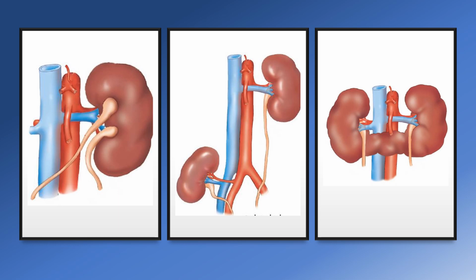Here we've got that bifid renal pelvis with the duplicated collecting system. We can only see the proximal part of these ureters, so we don't know if they're going to fuse somewhere below, so we don't know if this is an incomplete or a complete duplication.